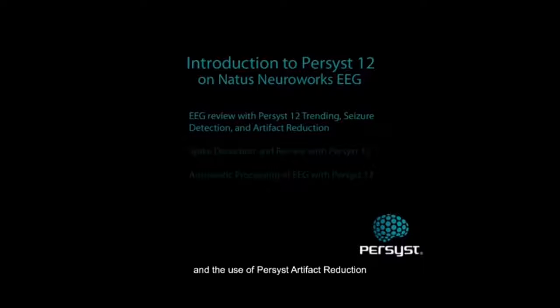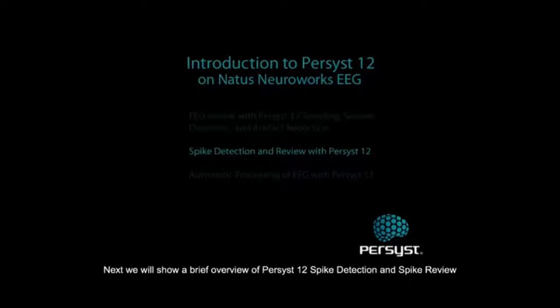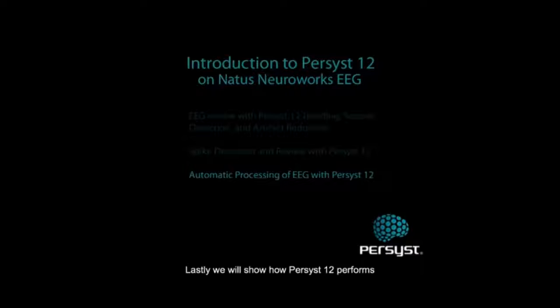and seizure detection, and the use of Persyst artifact reduction. Next, we will show a brief overview of Persyst 12 spike detection and spike review. Lastly, we will show how Persyst 12 performs analysis automatically during acquisition with no user intervention required.